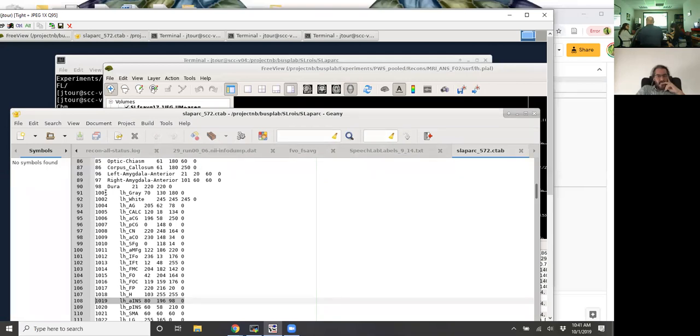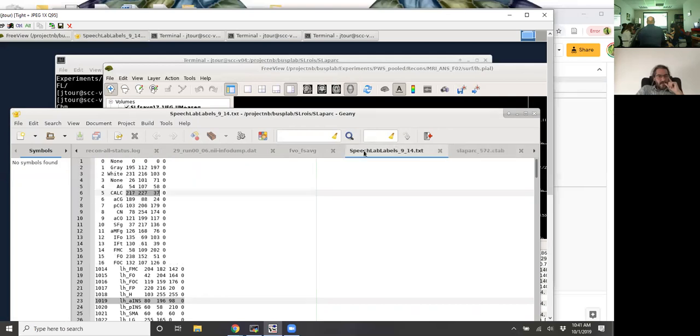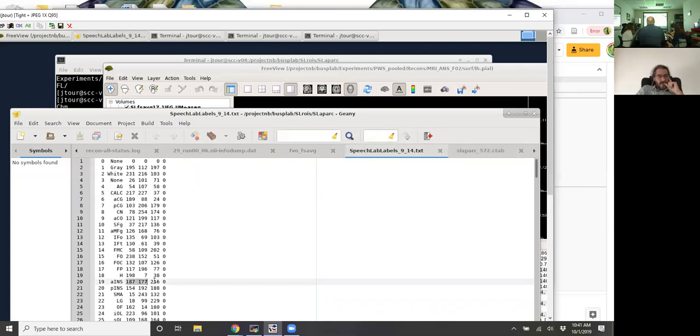It's a function of this. So I think it's something like this plus 2 times this plus the square of this. And what you have by doing that, you can just create this gigantic set of potential unique values.